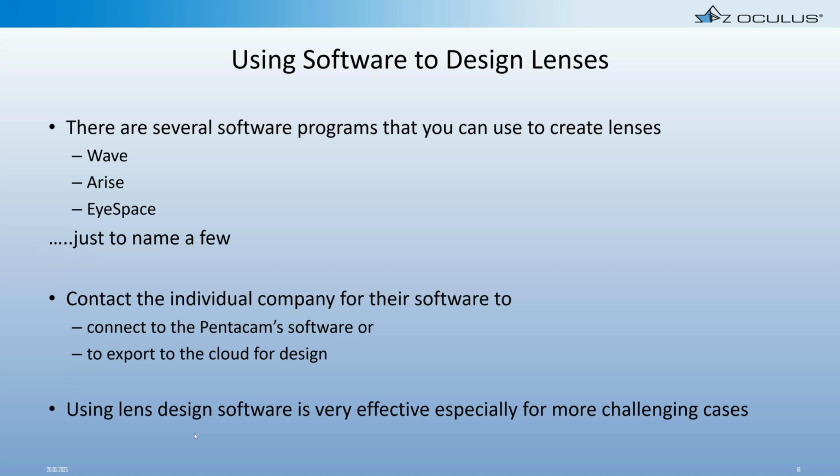There are ways to connect the software to the Pentacam software so that you can take your map and open up a new screen, and it will populate the software with the map. Or there are also some that work in the cloud, and it will pull up your Pentacam into their cloud-based design software where you can then create the lens in that modality as well.